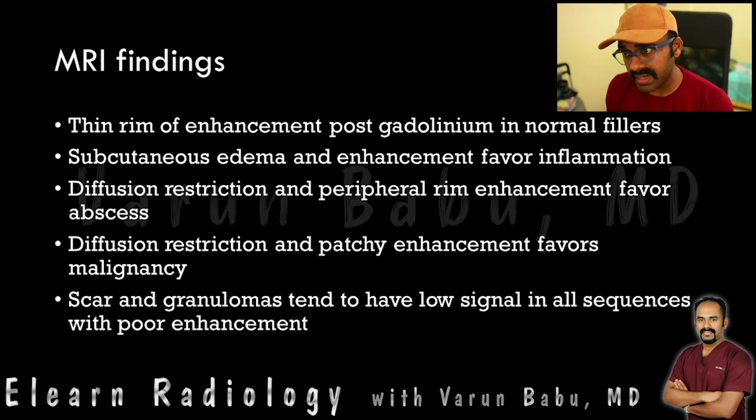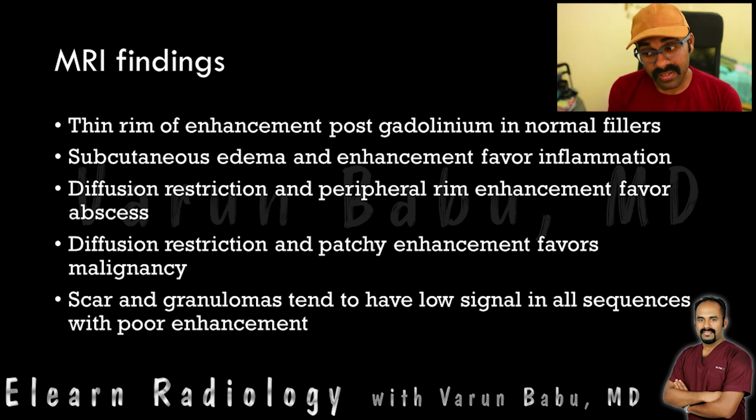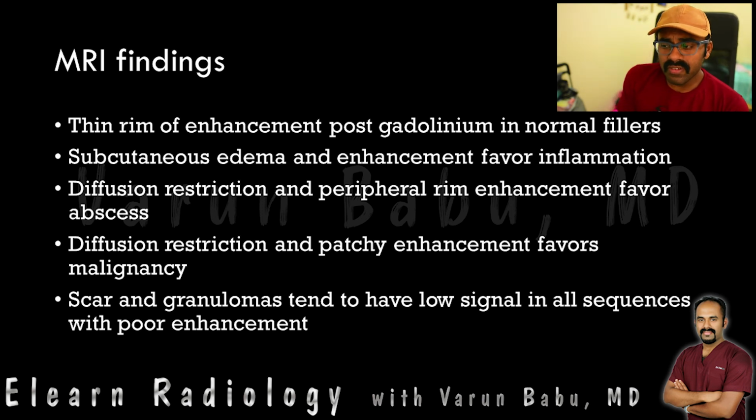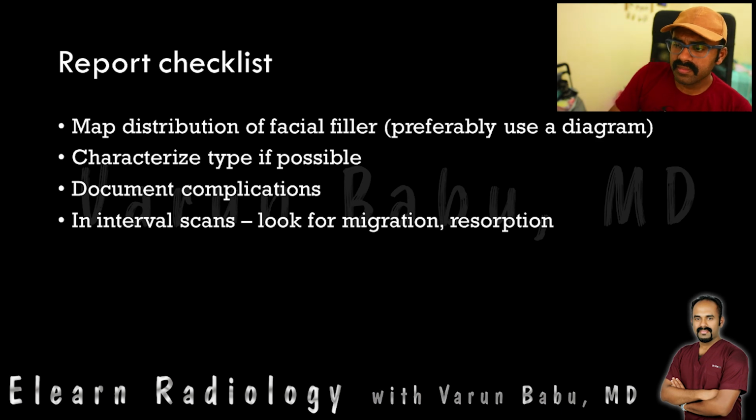Keep in mind clinical history is also important. If there is diffusion restriction and patchy enhancement, one should be considering malignancy. Scars and granulomas tend to have low signal in all sequences with poor enhancement.